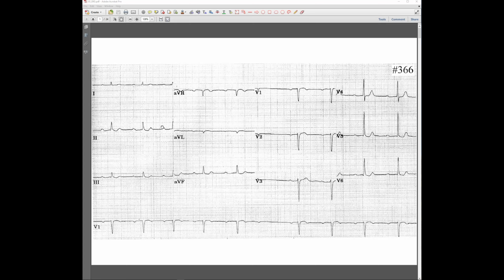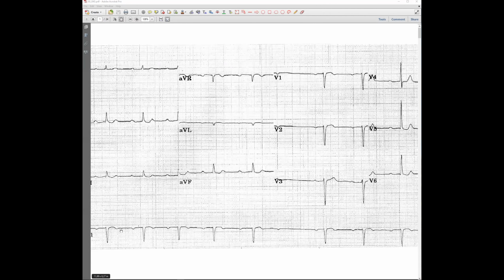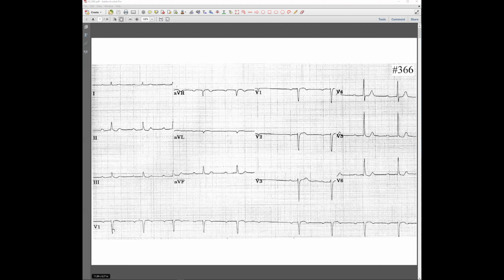So as we can see, the heart rate is rhythmic. The rate is slow, but it's still normal. So is this rhythmic? You have to look at this long strip at the bottom, the V1. It's rhythmic except here, but in that sense it's rhythmic. I don't think it is rhythmic. But can I go there after? I'll talk about the PR interval and then the RR interval.